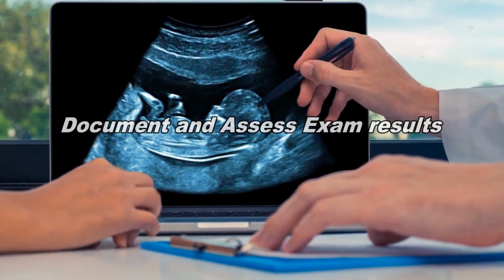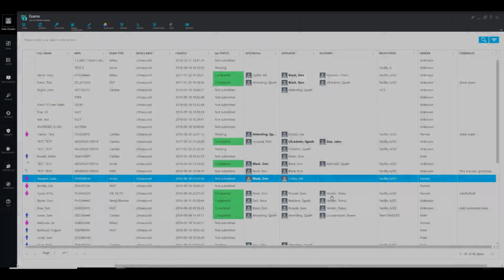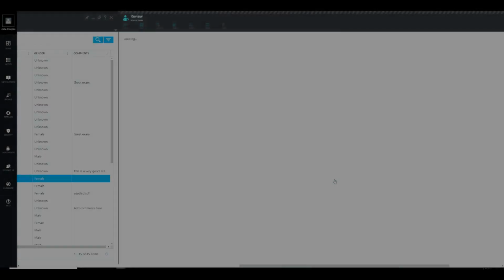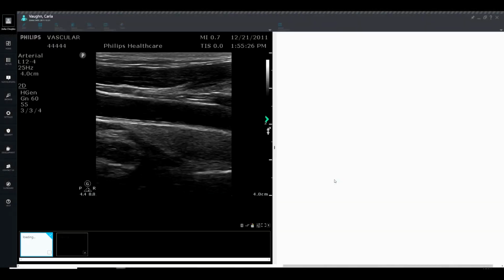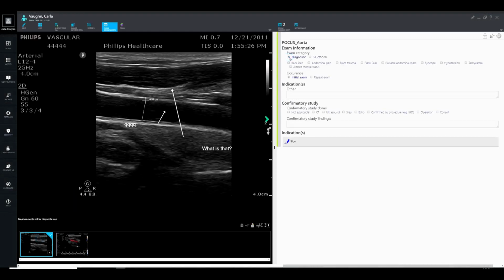Hello. In this video we will show you how you can document and review your ultrasound exams. An operator or an assigned physician opens their exam record which has not submitted status. User completes the attached exam worksheet and signs it.